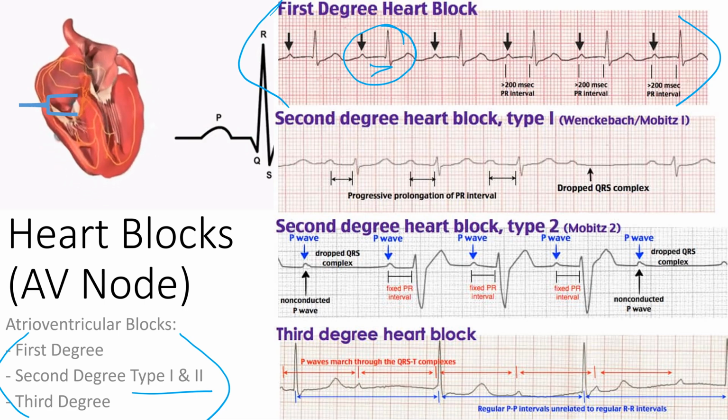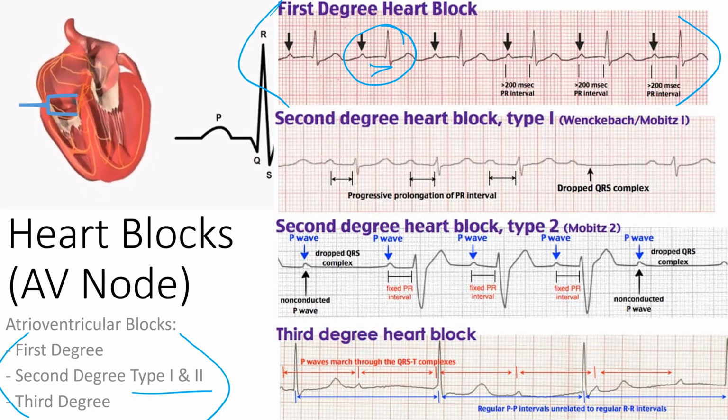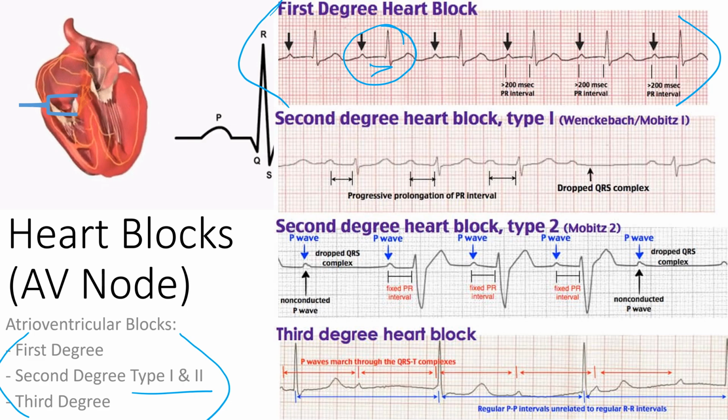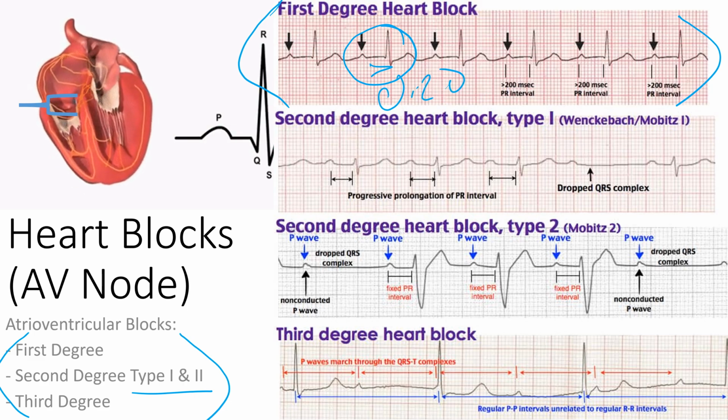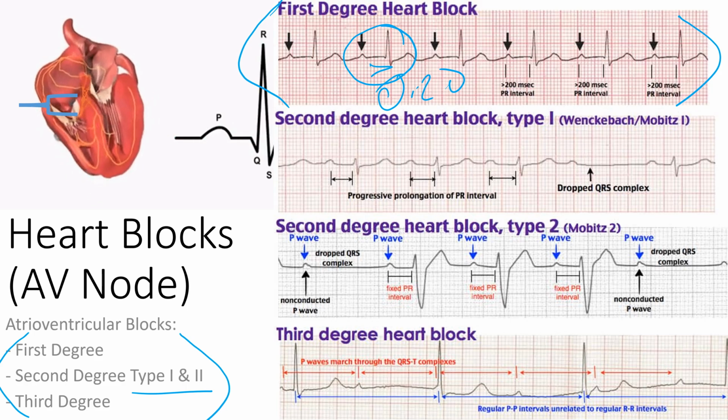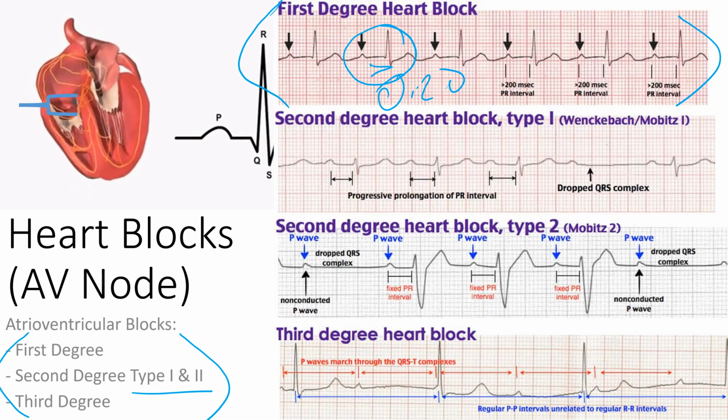And what's a normal PR interval? We don't care what the low one is, right? Unless you're worried about Wolff-Parkinson-White. We're worried about what the prolonged one is, right? What's the high end? 20, right? So greater than 0.20 equals an AV block until proven otherwise, right? And usually it's an AV block. If your PR interval is more than 0.20, that's a problem. If it's more than 0.24, you're definitely not giving any kind of AV blockading agents.